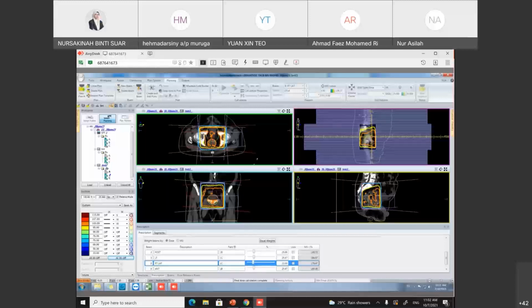The 4-beam technique, we will call it the 4-field box technique, because the dose distribution becomes a 4-field box. I think you also learned this from the book. So the 95% and the 70% is now the 4-field square from all the treatment area. So now, am I satisfied with this plan?